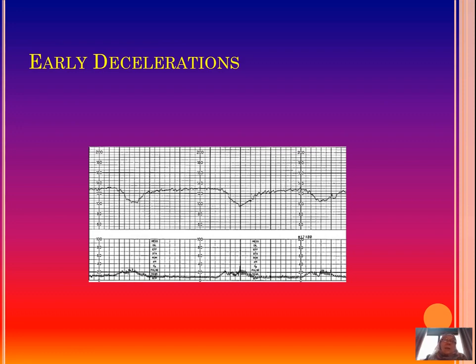You will hardly see them on a CTG. They are an expression of what? That's right, they are an expression of fetal head compression and are a benign feature on the CTG. So they do not represent a major abnormality. Because they represent fetal head compression, they usually occur in the advanced phase of the second stage, when the baby is deeply engaged in the maternal pelvis, and therefore they are not so common as other forms of decelerations.